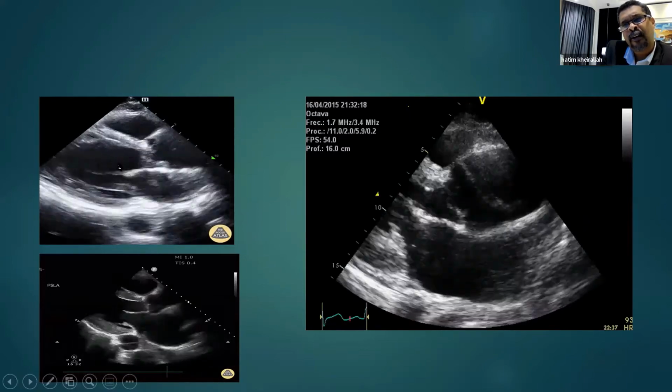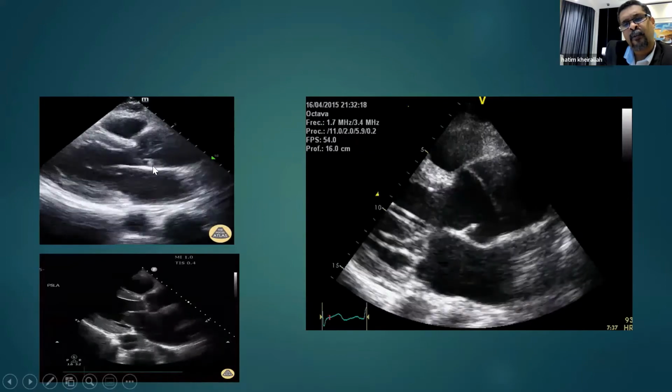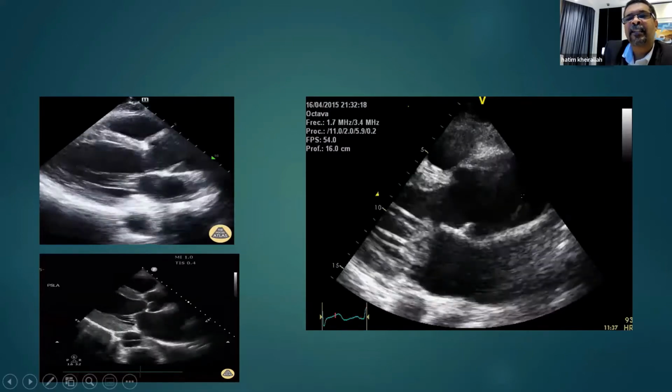I lost you, Ryan. I lost you. Are you still there? Hello? Yes, yes. I'm following, Mr. Hatim. So this is a dissection flap. This is a dissection flap.